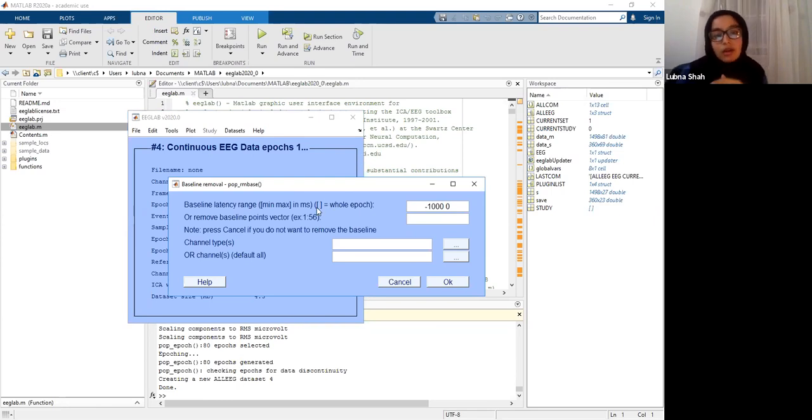Another part of epoching, and this is related to almost filtering the data, is this pop-up that will automatically show up when you epoch, and it's about baseline removal. For this one, we're just going to go with the standard, removing this range of values, but depending on your data, you can manipulate it.